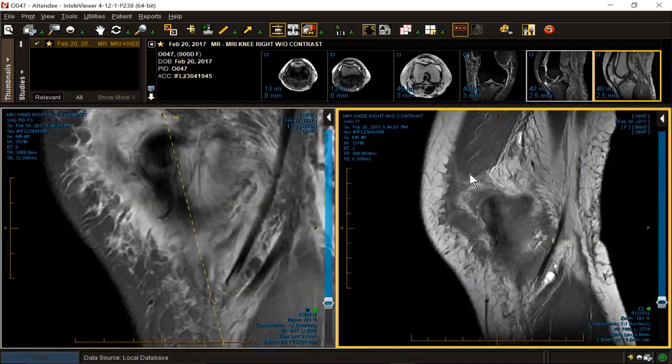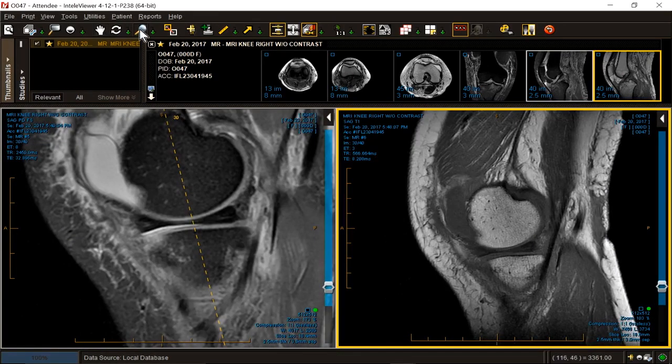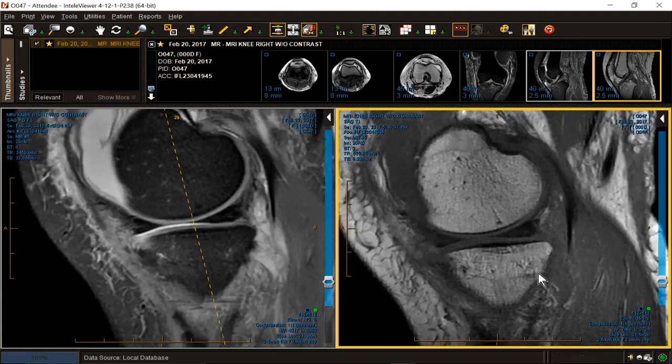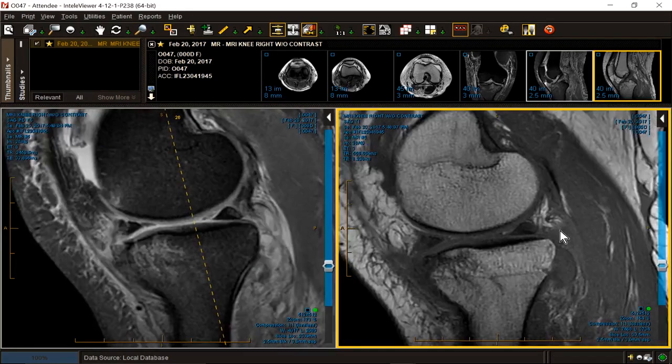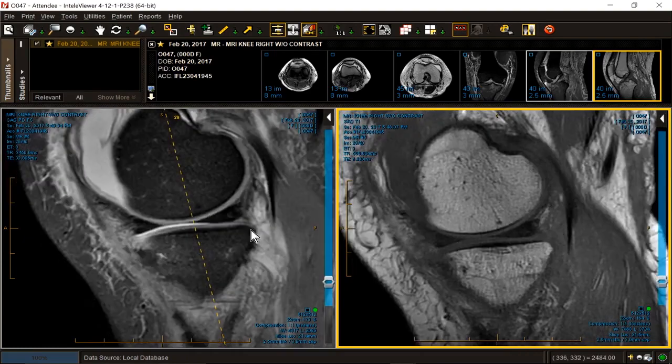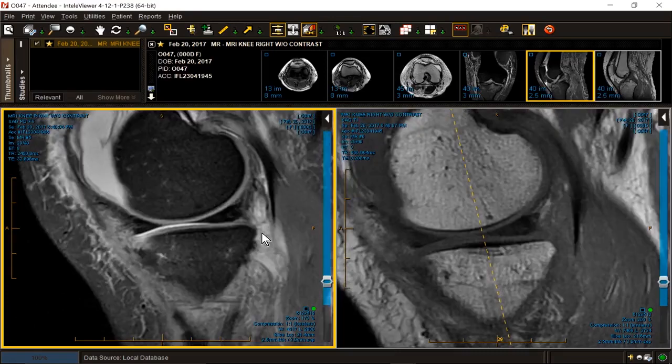Let's look at the T1 and blow it up. You'll see quite a bit of blood in the neighborhood. The posteromedial corner is far more impressive on the water-weighted image than on the fat-weighted image, where everything is just simply gray. Look at all the capsular stripping and detachment seen in the posteromedial corner and the meniscocapsular separation.